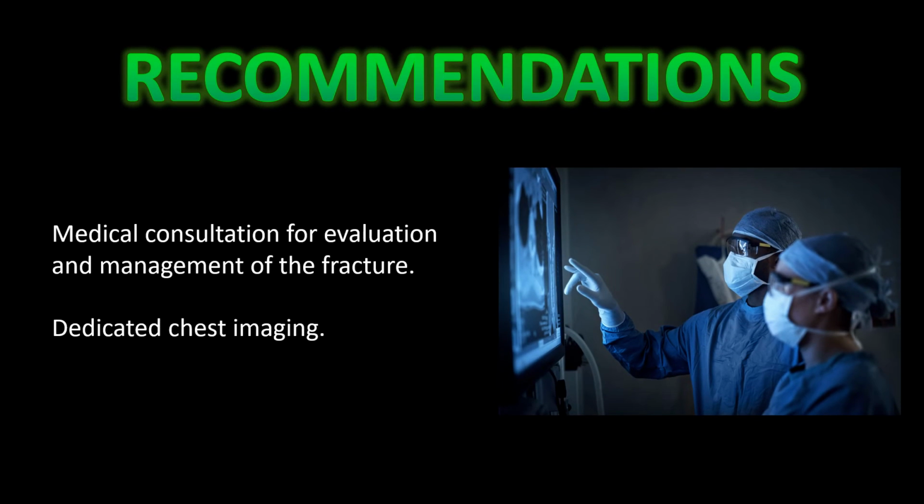So the recommendations for this patient are, like all fractures, a medical consultation for evaluation and management, as well as dedicated chest imaging. So at a minimum, a dedicated radiographic examination of the chest and ribs to better evaluate it rather than just this one view of the thoracic spine, and at best a CT of the chest to evaluate for any type of secondary complications like pleural effusion, etc. So this patient needs to be referred for a medical consult, and that is exactly what this was: one fractured rib with an adjacent extrapleural sign and no pleural effusion.